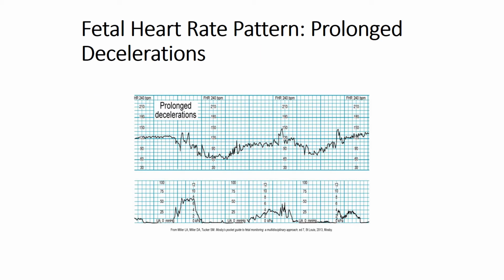And this is something called a prolonged deceleration. That's defined as a decrease in the fetal heart rate below the baseline. The decrease in the fetal heart rate is 15 beats or more and lasts for at least 2 minutes but less than 10 minutes from onset to return to baseline. A prolonged deceleration that lasts more than 10 minutes is a change in the baseline, and that's probably going to be called bradycardia. But if it's from 2 minutes to 10 minutes, it's going to be called a prolonged deceleration. And this can be an ominous sign as well.